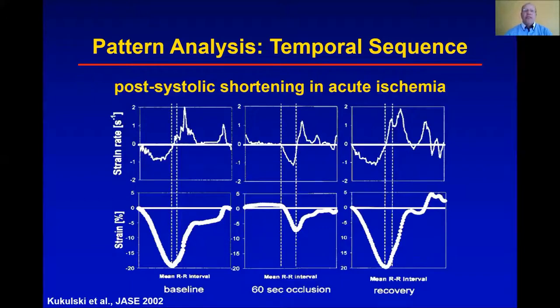And what you can see is after 60 seconds of balloon occlusion, this strain curve, which shows a normal pattern at baseline, has a completely disturbed pattern during this acute induced ischemia.